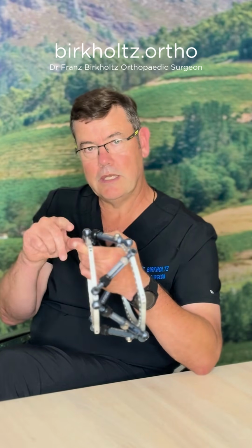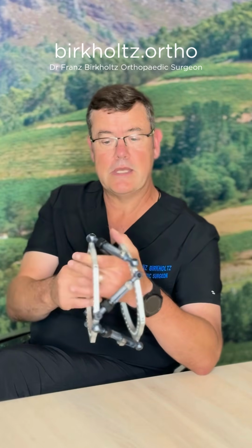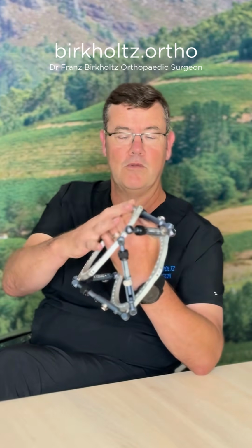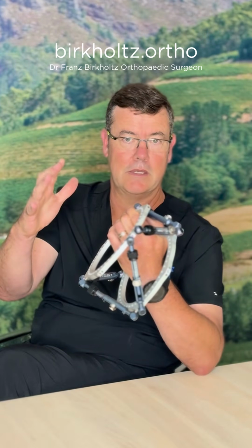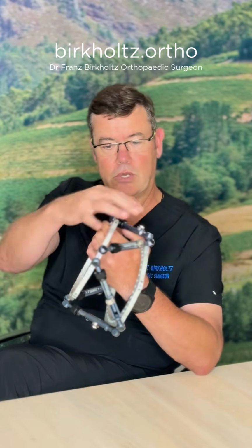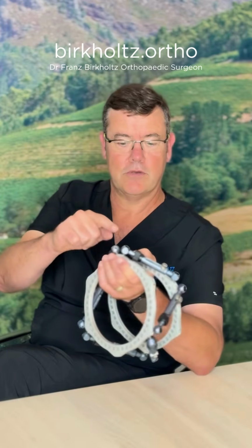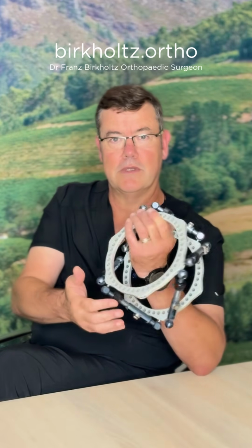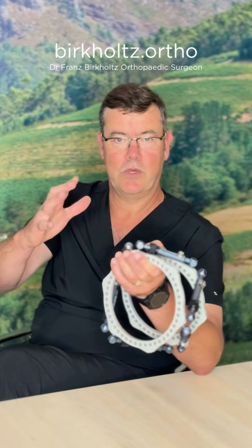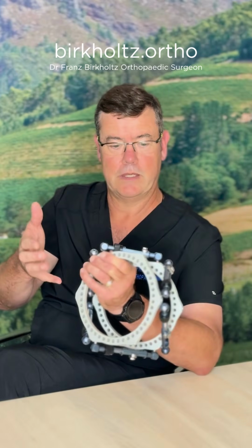But more interestingly and more pertinent to what we're talking about in limb lengthening is actually the ability to gradually move these rings in 3-dimensional space. And we do that by applying everything, locking everything into place, and then by adjusting each of these struts by a different amount, we can make these rings move gradually over time around in 3-dimensional space.